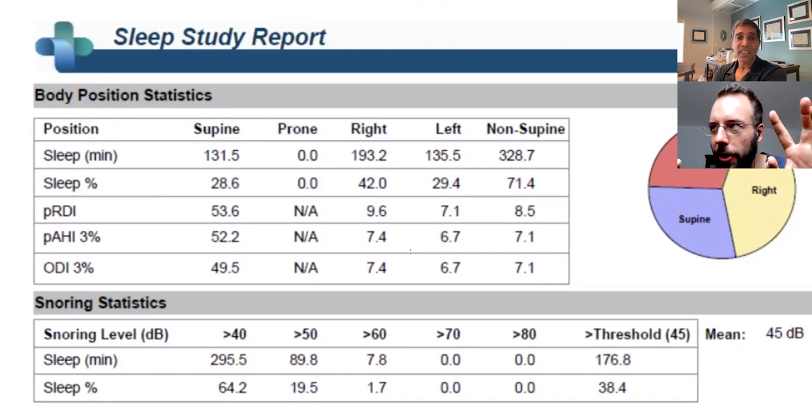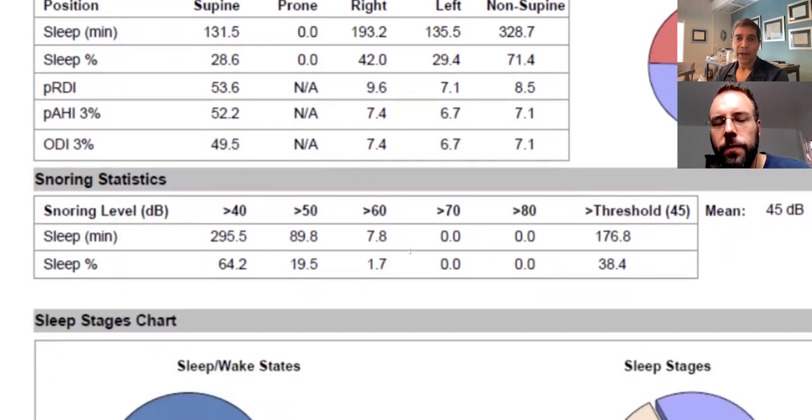Not with 100% certainty, but can you start to get an idea of what the problem might be anatomically for this person? Well, then it's just gravity. It must be the jaw, the tongue. It must be the pharyngeal airway collapsing. It's not really the nose as much in this case. Now, it's like Bernoulli's principle. If you have a tight nose and you suck harder, it could collapse the pharyngeal airway. But based on this, it's that jaw that should be the issue.